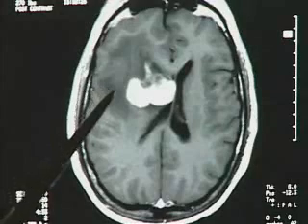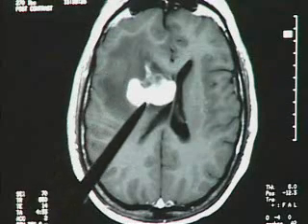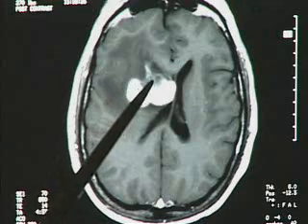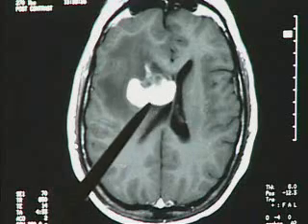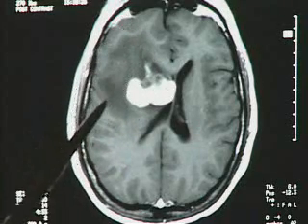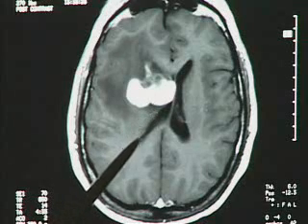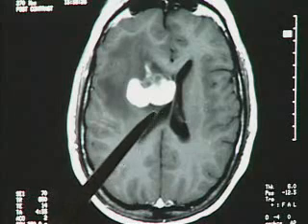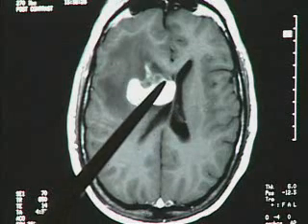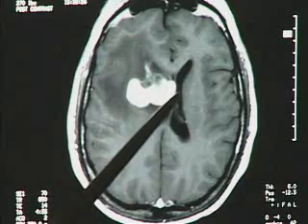This is Jerry's MRI of the brain with contrast. Here we see the tumor that's outlined in white. And you can see that it is in the right hemisphere, and surrounding the tumor is the cerebral edema that is gray. The tumor is pressing the right lateral ventricle across the midline. And you can see that the tumor is also compressing the left lateral ventricle.